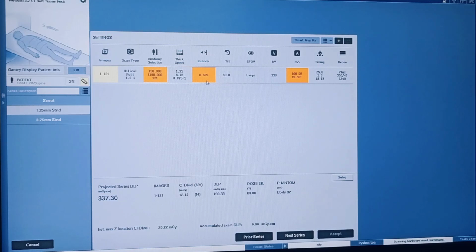And exposure itself is different. Yes? There will be no difference in dose. If the dose increases, the acquisition time will increase, but you have to get better image quality also, no? Because neck and shoulder are there, so lots of attenuation will be there. To overcome the streaks you get here, the best way is to reduce the interval.